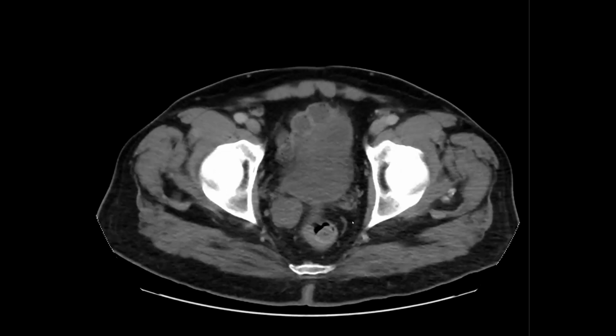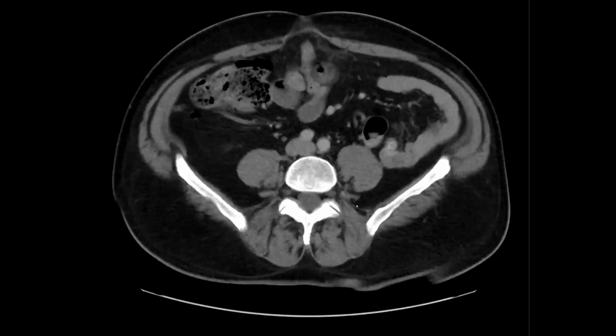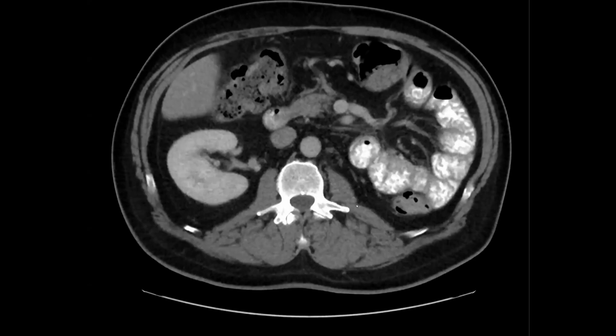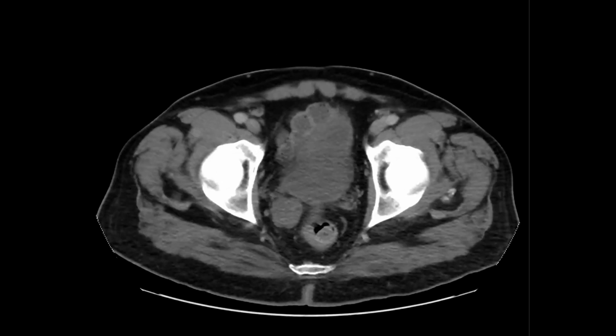When I look carefully, sometimes in older patients the seminal vesicle is truly atrophic, but in this case it's probably absent, and the kidney is absent, and the right seminal vesicle is just distended because it's doing the job for the two.